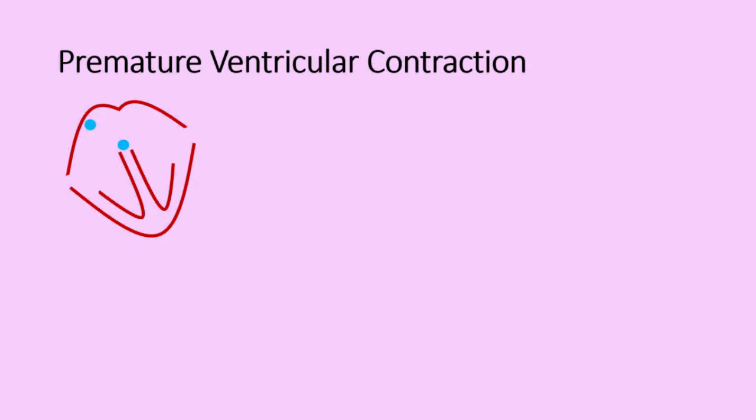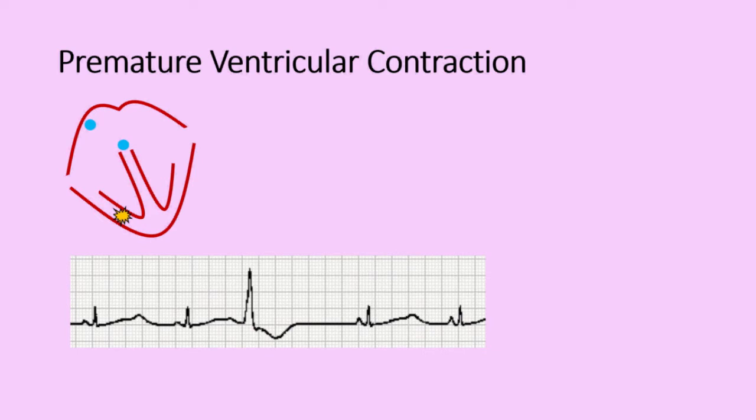Similarly, you can have a premature ventricular contraction, or a PVC. In this case, the electrical impulse is generated by an irritable foci somewhere in the ventricles. When this happens, and you look at an EKG strip, what you see is a large QRS complex that is wide as well and is not preceded by a P wave. So here, this is our PVC. This irritable foci beats out the P wave and depolarizes the ventricles prematurely. Again, like with a PAC, afterwards the SA node takes control of the rhythm back.